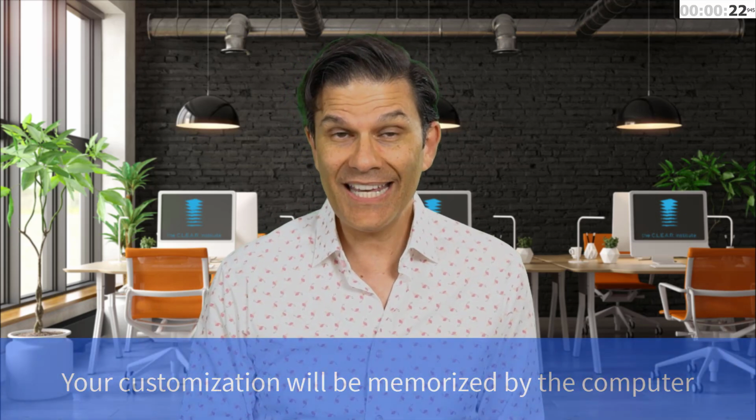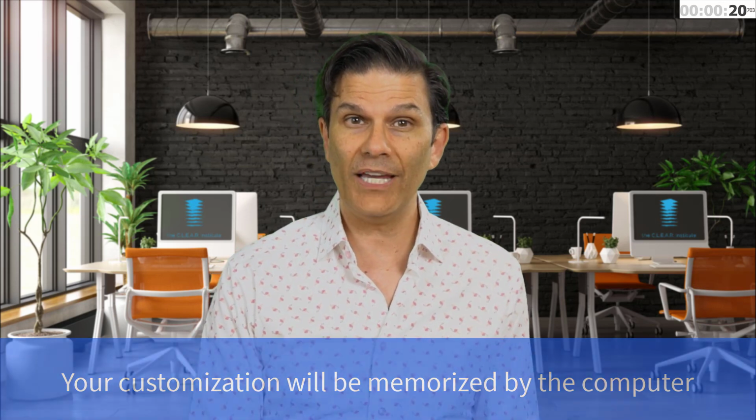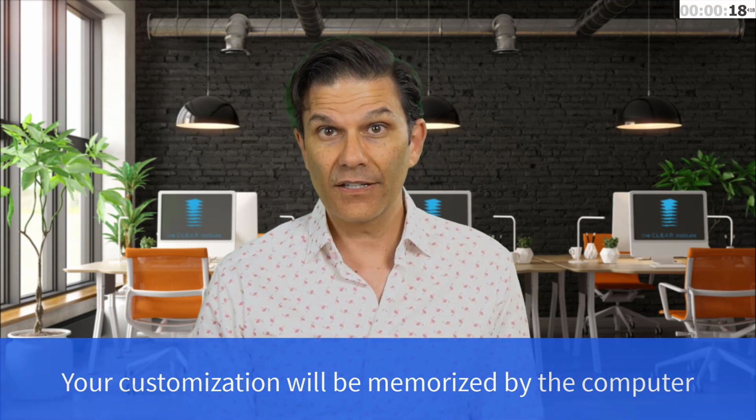What is nice about that is your ClinCheck on that computer will now by default be set like this, meaning when you close it and open a new patient, the customization will stay customized. In future clear tips, we will get through all the tools one by one.